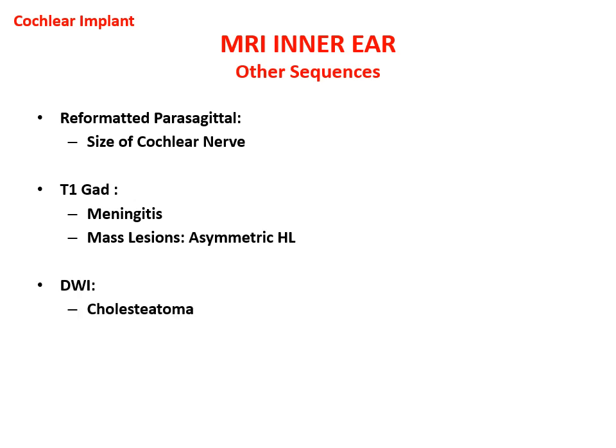The diffusion weighted image is used in cases of cholesteatoma which have been operated and are prepared for cochlear implant, and we want to see if there is recurrence or not before going for cochlear implant. It will be discussed in another video. And the last sequence, which will also be discussed in other videos, is the FLAIR technique, and this is mainly to detect demyelinating lesions, and there are other indications which will be discussed in due time.